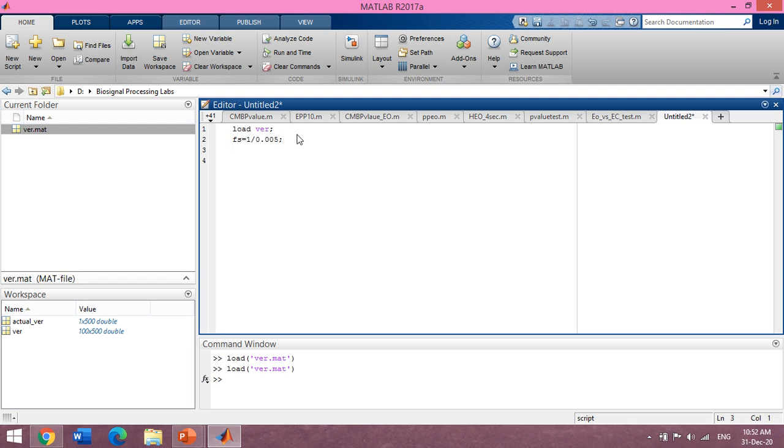We will use the MATLAB averaging routine mean. Remember, if mean is given a matrix variable, it will average each column. Therefore, if various signals are arranged as rows in the matrix, the mean routine will produce the ensemble average. Therefore, the next step is to determine the size and orientation of data. If the number of rows is greater than the number of columns, then we will need to take the transpose of data. Otherwise, there will be no need to take the transpose if the number of rows is less than the number of columns. It will mean that signals are arranged row-wise.